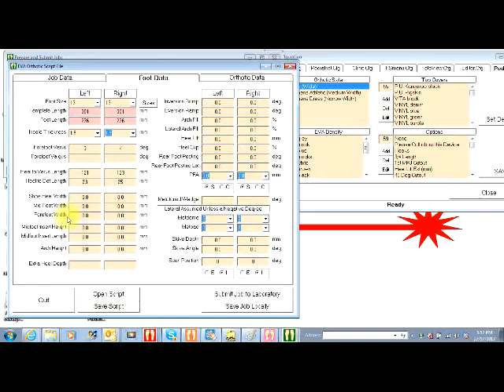Again, if they've got that arch bulk, they can measure the height that it needs to go to and the insert length. The arch height, some of the podiatrists these days will define how high they want the arch to come, they put that in there. Extra heel depth, which is down here.